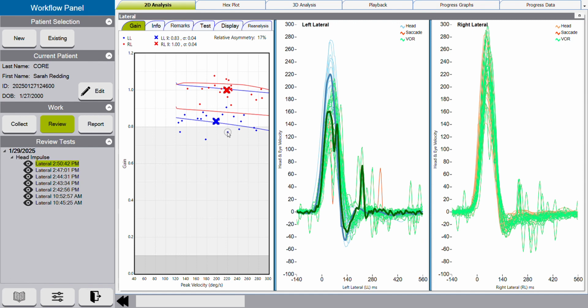And so what you'll notice over here is the blue lines and then the green lines on the next screen over. So see how it highlights? I'm going to unhighlight. Everything disappears to the right. And then when I hover over it, it creates these impulses on the right. Now, I'm going to try to move my mouse.